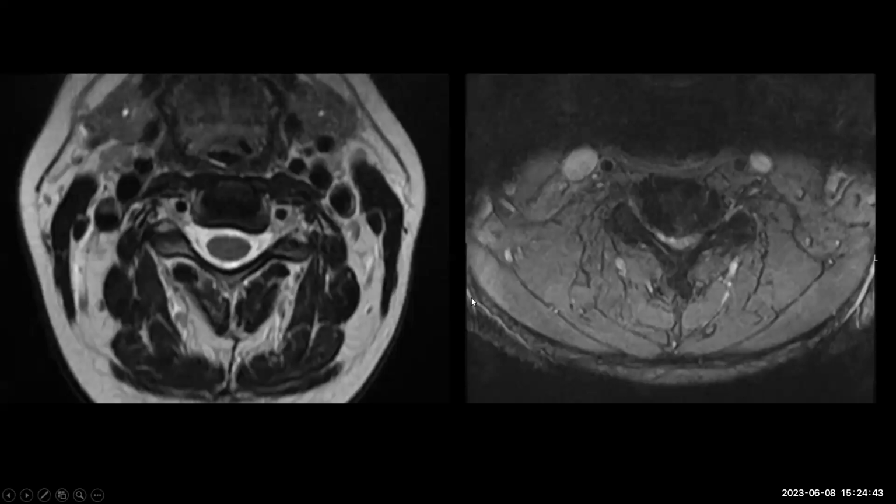Just to make it more evident, I'll put up these two cases side by side. This is how it should normally look. The anterior convexity of the vertebral body is preserved. You can see the cord. There is voluminous CSF around it, quite capacious. And these are the exiting neural foramina, which are quite ample.